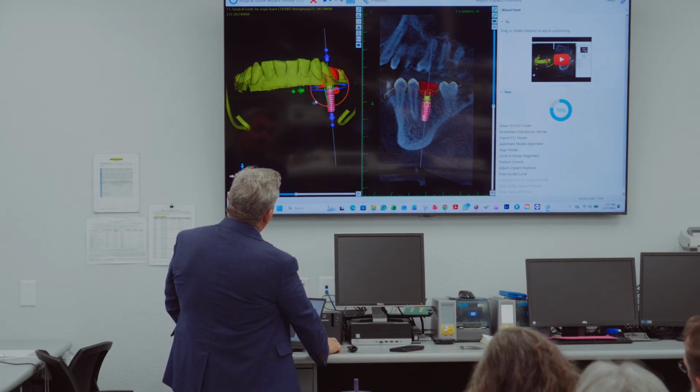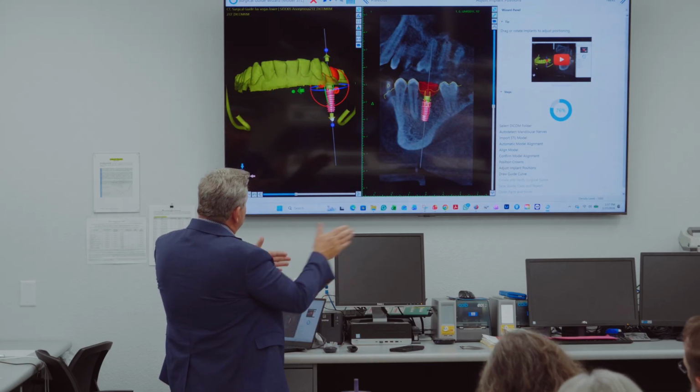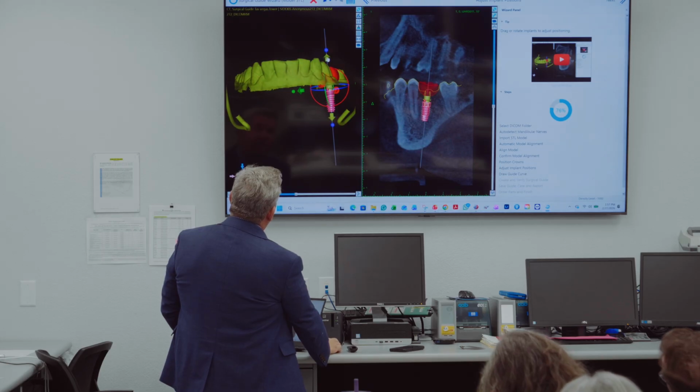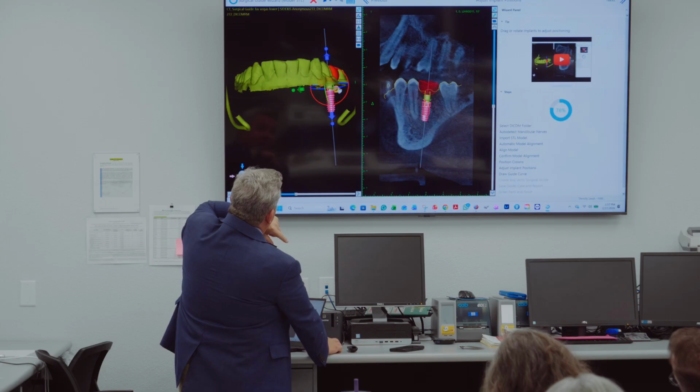Now these arrows, what they mean is, the arrows just mean lateral or axial movements in the long direction. So just take that and move. So I'm moving only the crown, okay? And it's moving it on both axes. So see, I'm moving it up, and I'm moving it down, okay? Or I could rotate it. I could rotate it around.